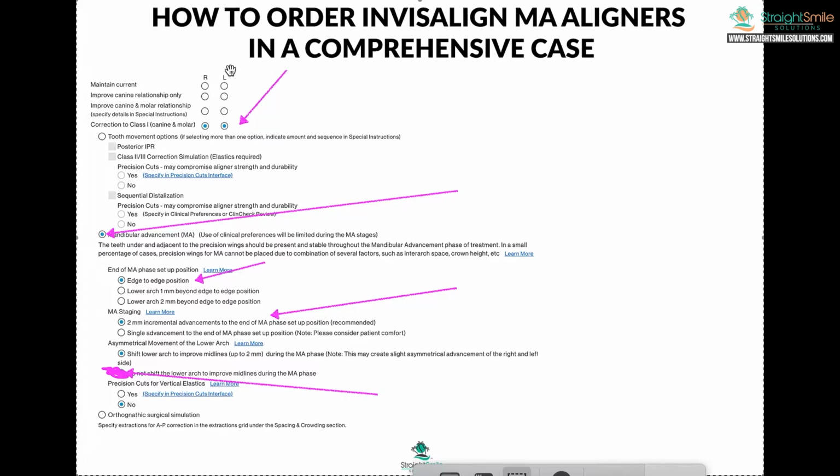I just thought about this after the case, because they don't necessarily look at the birth date. In my fake patient, the patient was an adult that I put in. The patient was 19 and yet it came up.